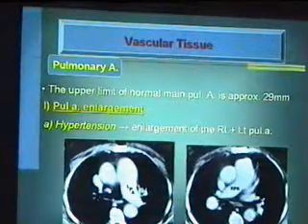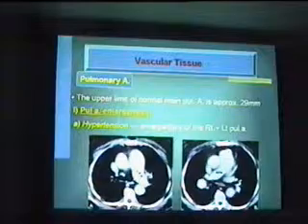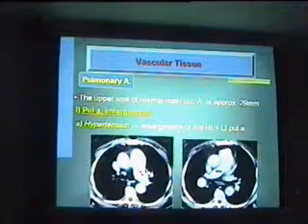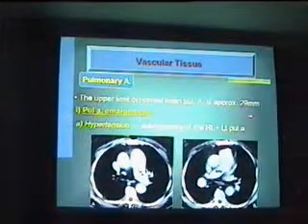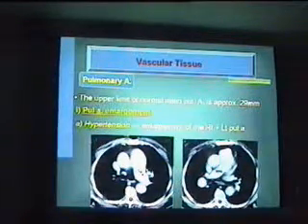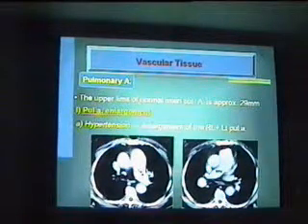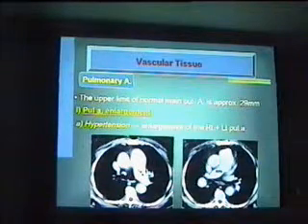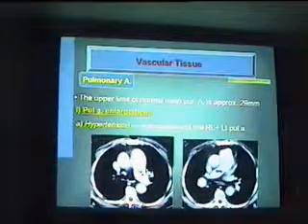سيبنا بقى من الأورطة نخش على البلمونري artery. الأورطة قلنا إن 4 سنتيمتر نقول عليها aneurysm، لأنها 3.8 أو 3.9 is the maximum normal diameter of the aorta. الماكسيمم بتاع البلمونري artery، أوكي؟ It is nearly 2.9 سنتي، يعني الثانية كانت 3.9 وده 2.9. أوكي؟ عشان ما نحفظش كتير. ده الأبر ليميت أوف نورمال للمين بلمونري artery.